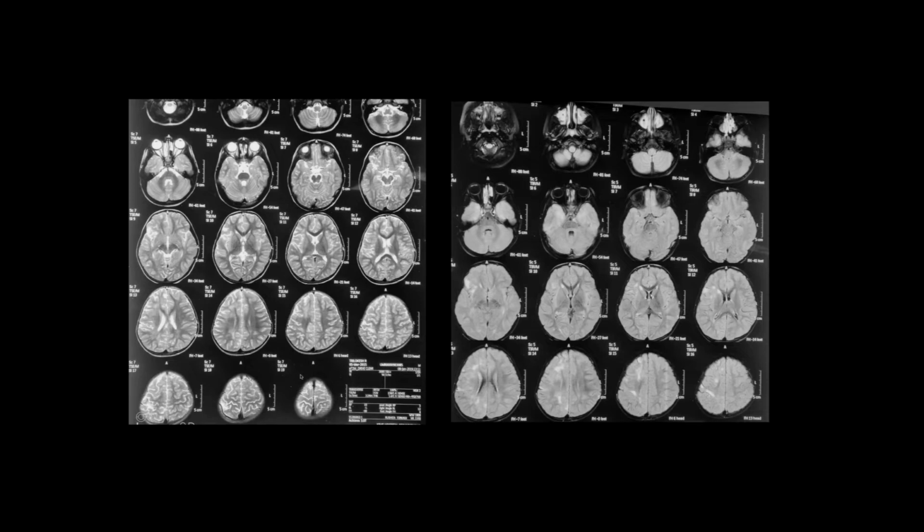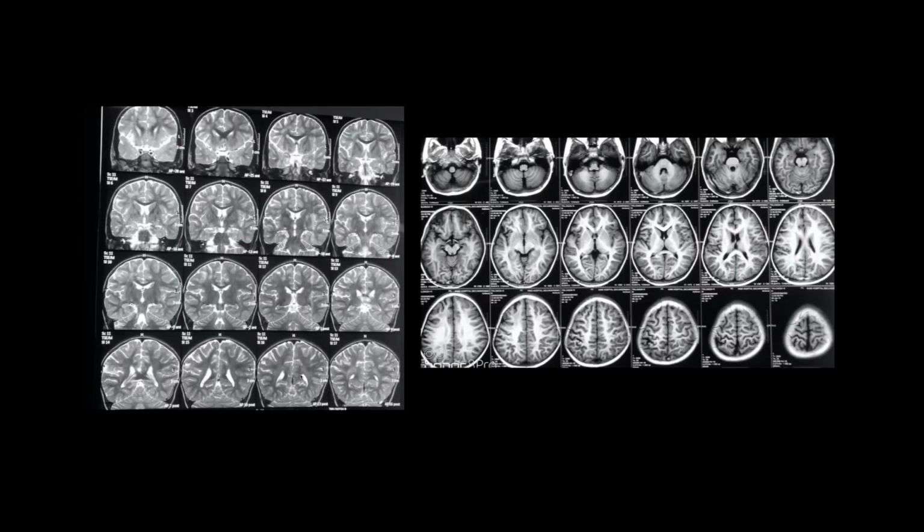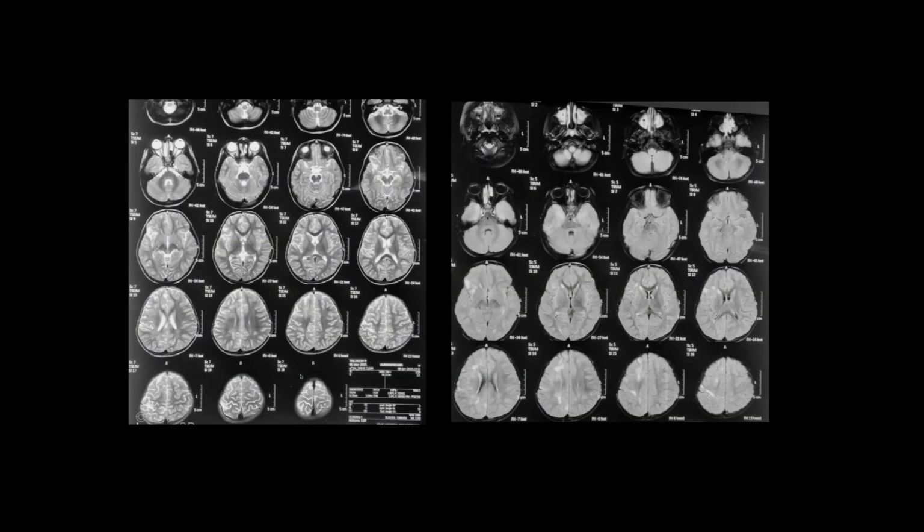I don't have diffusion in this. Actually, it's a late scan. It's at the age of 8 years. This is a late scan. It was not in the acute period. Because of epilepsy, we did the scan. There is no restricted diffusion.